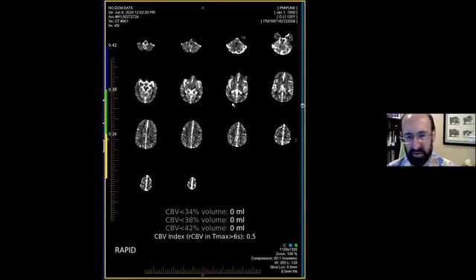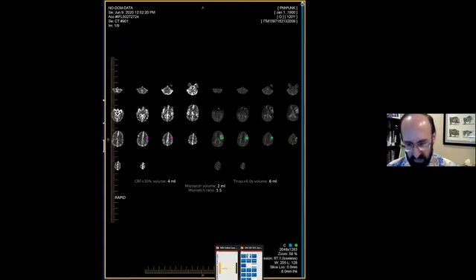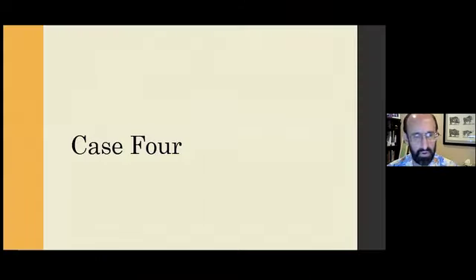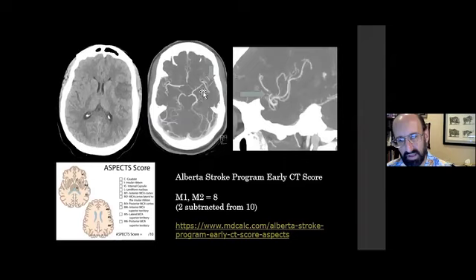And this is pretty much how we analyze our strokes currently at Johns Hopkins. We report the rapid values. So let me just go back to here. This patient had on the CTA, I didn't show this, a focal area where there was absence of enhancement on the CTA within the middle cerebral artery beyond the bifurcation. So this was a peripheral branch that was at sort of the M2, M3 junction where there was absence of enhancement within the blood vessel, so a focal clot, which was accounting for this stroke.